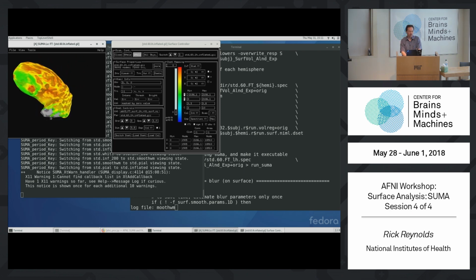And what about this down here? It's like nothing there. Why is that? Yeah, exactly. There is nothing there. We don't have data there. We don't have full coverage. The EPI volumes don't cover the entire surface. So the lower part of the brain we're not capturing, or maybe it's even on an angle. Maybe you're missing a whole angular part of the brain. So we'll see all that here.